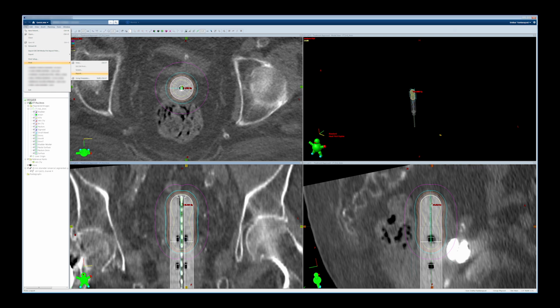So today we want to demonstrate a script for doing a second check on a brachytherapy plan. This is a cylinder plan. This script was developed for our clinical purposes, so the workflow might be different at different institutions.